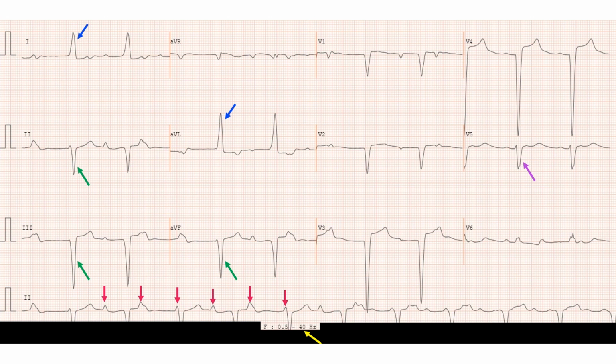This is a common problem with digital ECGs. If the person or caregivers are not mentioning the presence of a pacemaker in an emergency department, it is easy to mistake the ECG for just left bundle branch block. Of course, a routine chest X-ray will very well show the pacemaker. Changing the low pass filter to 100 Hz or more will show the pacing artifacts well. An alternate option in most modern ECG machines and monitors is to switch on pacemaker detection, which will produce a very prominent pacing artifact in the tracing, often of very large amplitude.